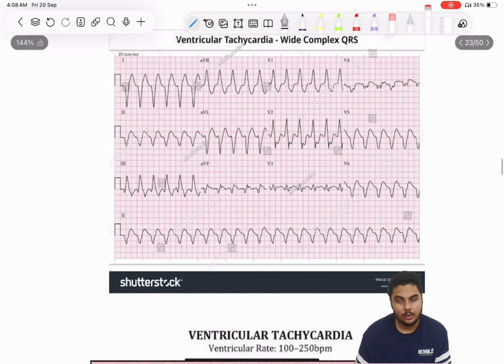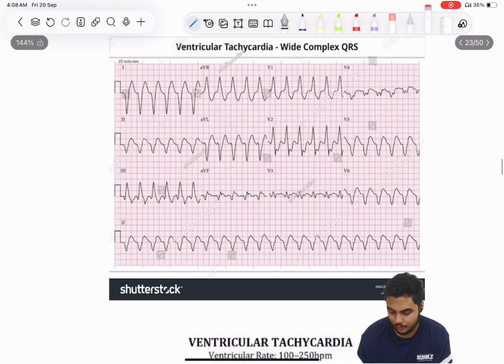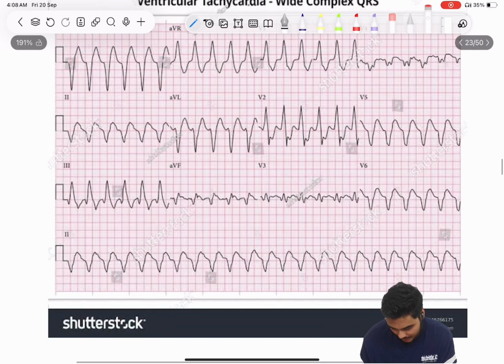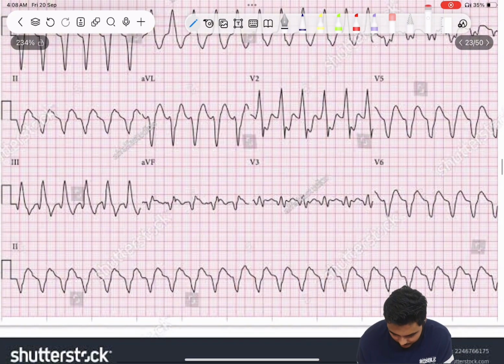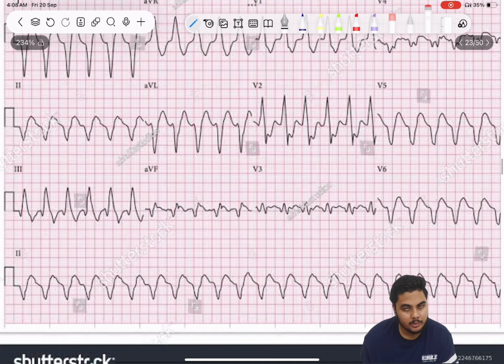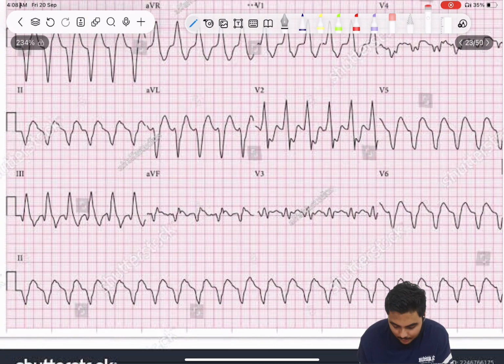Now just take a look at this ECG step by step. Now look at this ECG, right? First of all, the distance between the 2 R waves is around 2 to 2.5 large boxes, that is the heart rate is 300 divided by, let's say, 2, that is around 150 beats per minute. Next we see the rhythm is regular, equidistant R waves, right?